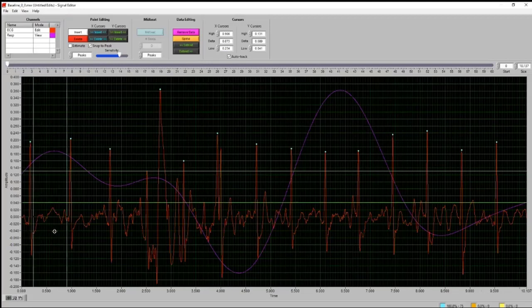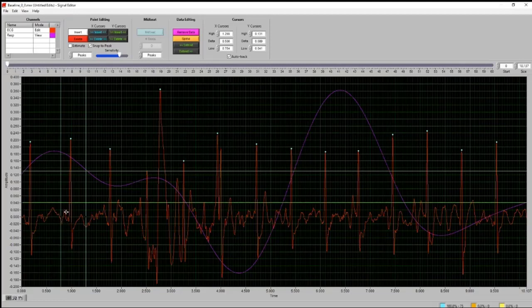So if we focus really on this cycle right here, this second one, I'm going to go ahead and show the entirety of it here. So the first thing that we're looking for is known as the P wave. That's that atrial depolarization of the atria of the heart. And so we see this upward inflection. And that's really, the signal is, this sinoatrial node is sending out this electrical command for the heart, and these different blips, either up or down, are those electrical vectors as they go through the heart, the chambers of the heart.